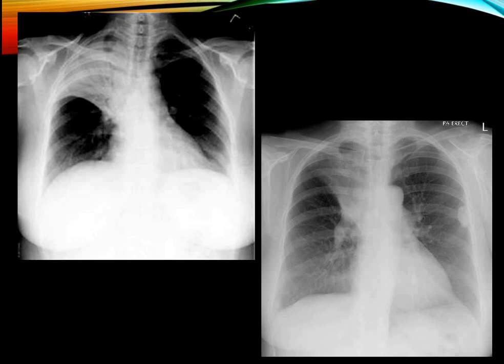The chest X-ray on the left shows patchy opacifications with some air bronchogram, limited inferiorly by a line. This line is concave upward, or elevated upward, and represents the horizontal fissure. Again the trachea and mediastinum are central, but the horizontal fissure is elevated. So we have one of the signs of loss of volume, and we are dealing with a right upper lobe patch due to the collapse.